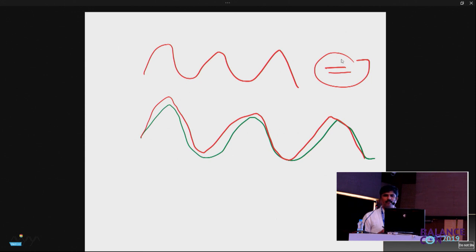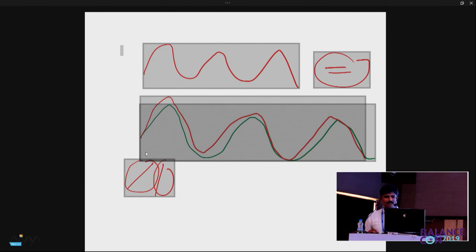Fine. We know two things from our previous discussion. Relative alphabets. What are those two relative alphabets? Slow versus fast. So this is slow. This is fast. This is slow with respect to this one. This is fast with respect to that one. Is that right? Now, let us imagine. That is one thing. And then we also have another thing called, okay.